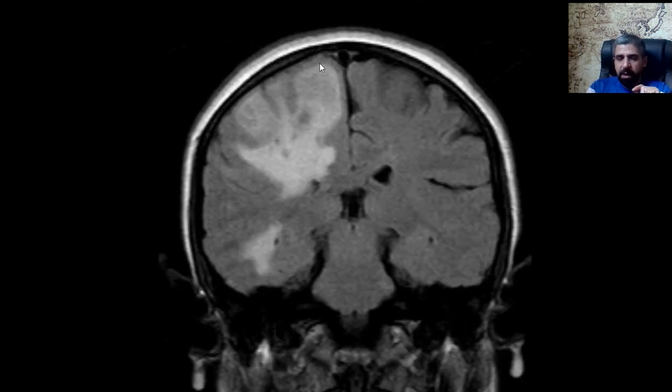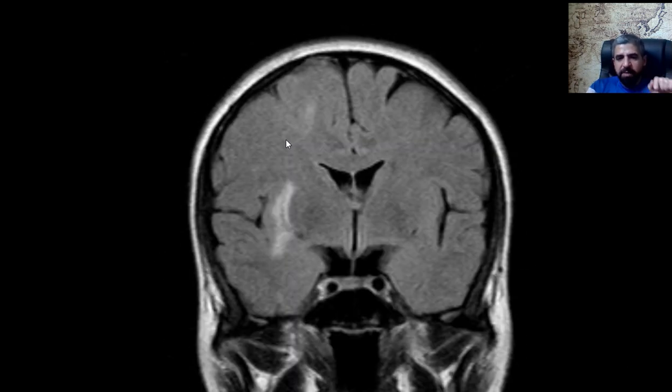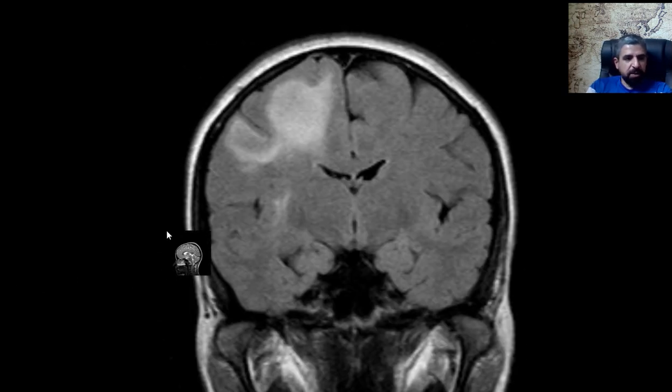Sometimes you can see T2 hyperintensity within the white matter that is not causing mass effect, and this indicates not edema, but some sort of demyelination or inflammatory changes. So not every white matter hyperintensity means there is edema. You need to look for causes of demyelination of the brain without edema. Edema is seen only in cases of malignancy, metastasis, and inflammatory changes, for example post abscess formation, and things like that. So let's go to the sagittal images.